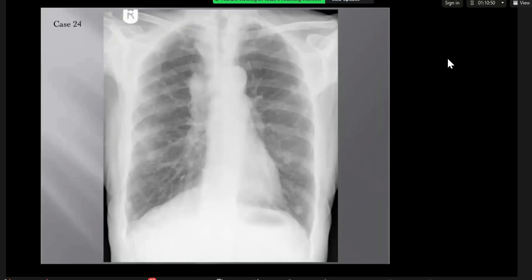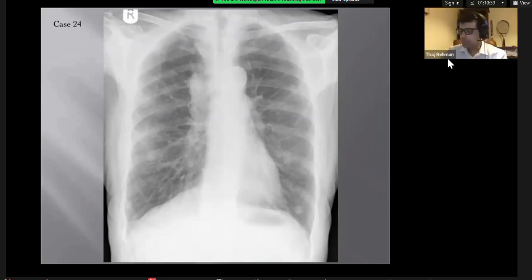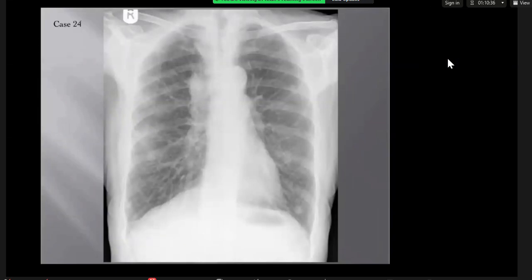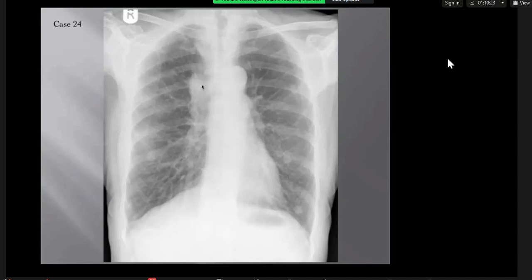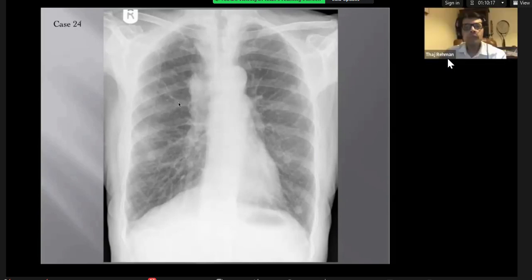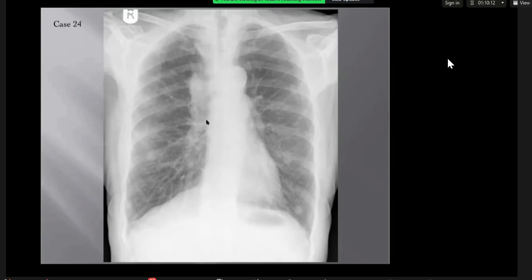This is the frontal chest radiograph which is demonstrating bilateral pulmonary nodules. There's also, I think the right hilar looked a bit bulky to me, but the normal V shape is maintained. The vascular hilar inlet is maintained. I'm just looking at the right apex. This looks quite bulky to me, parahilar right-sided. So I'm just wondering whether the patient has got a right hilar mass with metastatic pulmonary nodules.